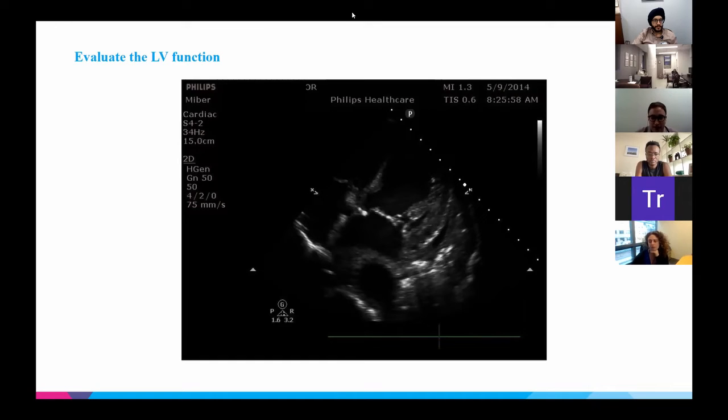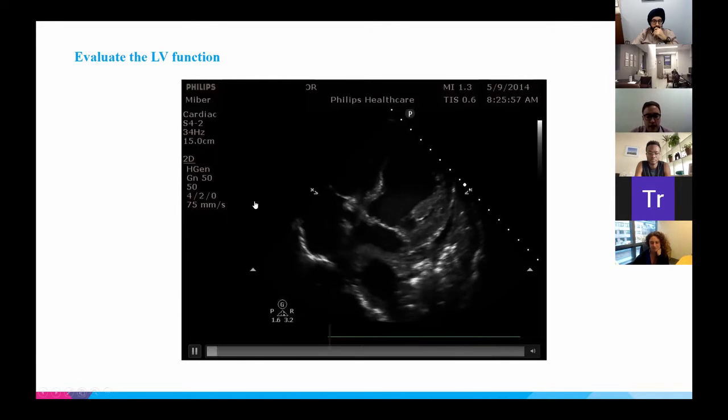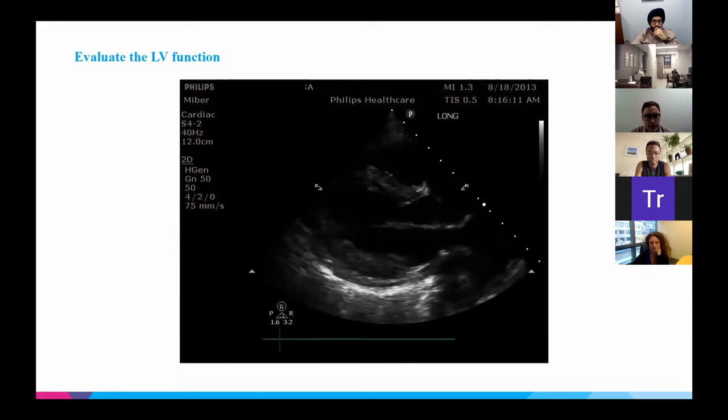Yeah. All right. So we have, I would say, a mix between reduced and severely reduced. Okay. All right, good. Maybe what we'll do is run through a couple other clips, and then we'll see if there's a pattern where you guys are getting caught off guard between some more than others. But I agree, it is definitely not hyperdynamic, right? All right. So then we'll go through the next clip, and then we'll see from there.